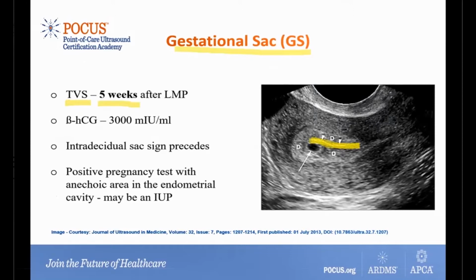So positive pregnancy test with the anechoic area in the endometrial cavity may be an intrauterine pregnancy.